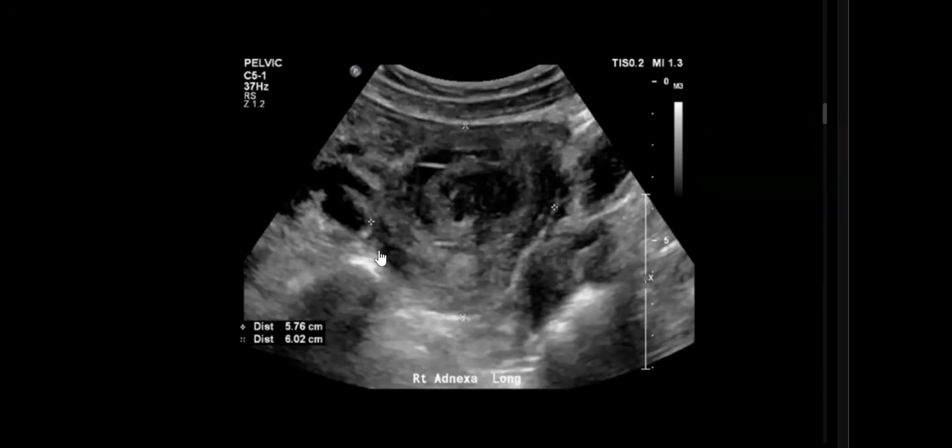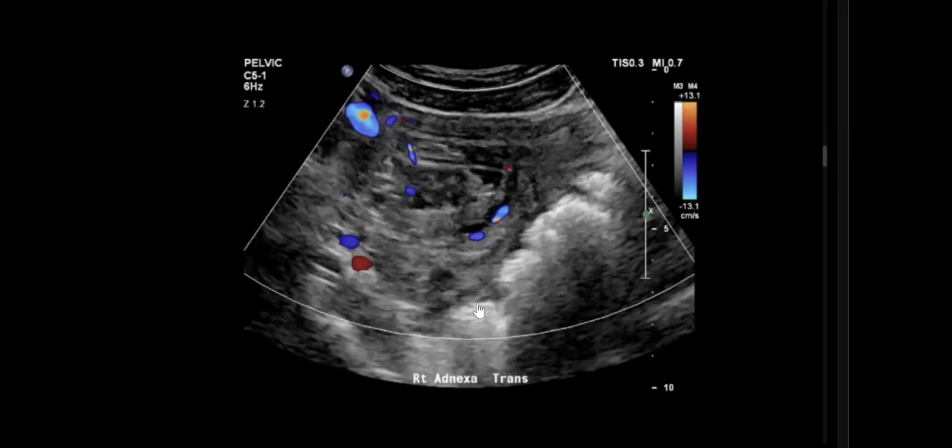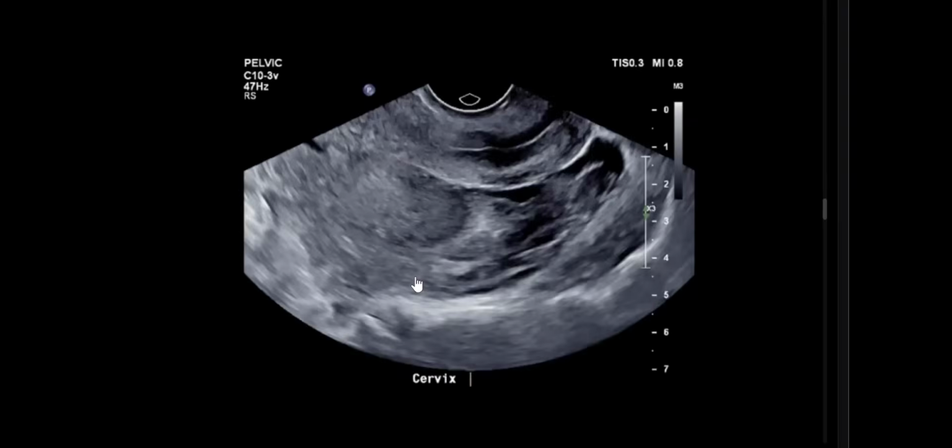I'll ask if the patient is married to do a complementary vaginal ultrasound. But we see something in the right adnexa. It's heterogeneous, mass-like. Most likely adnexal hematoma. Even if we see vascularity inside, no problem. It's maybe an ovary surrounded by hematoma. And we have to comment on the other ovary, which is normal. Left ovary, normal texture, normal size, but we have some hematoma around.